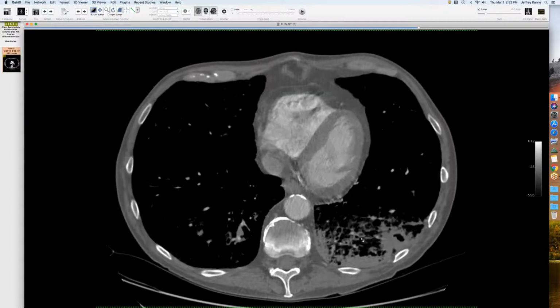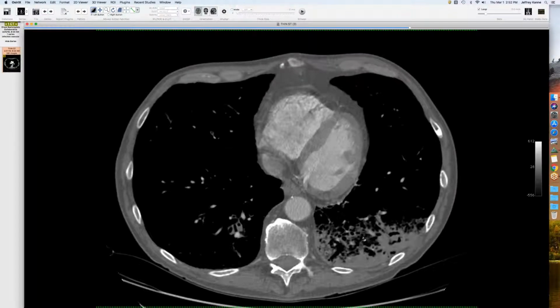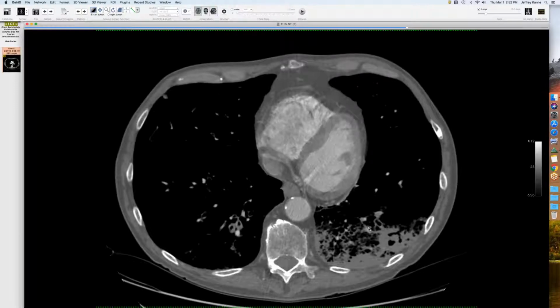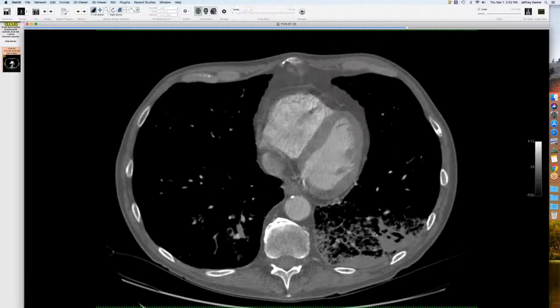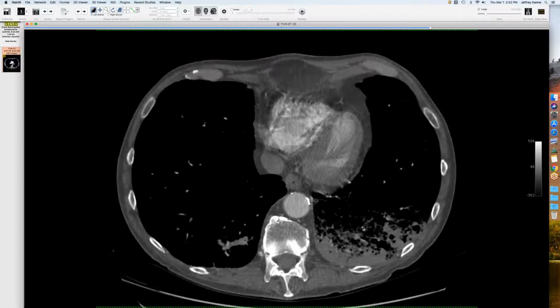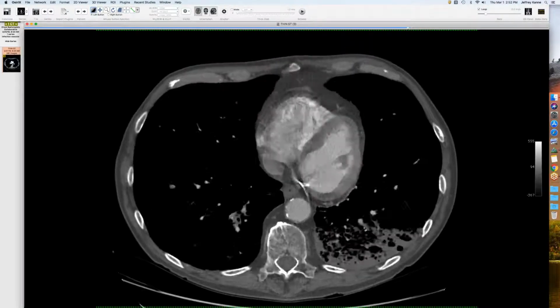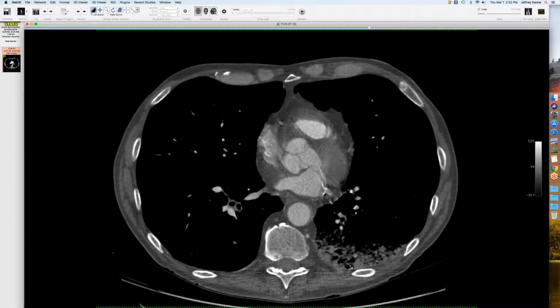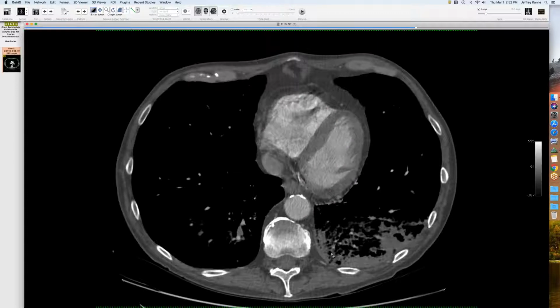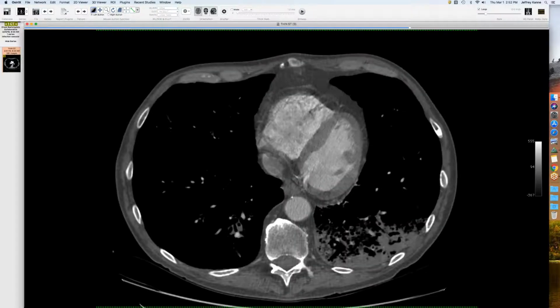But Jeff, let me turn this upside down. Could there be a pseudoaneurysm that has bled, and the consolidation you're seeing is blood, which is settling? It could be, and some of it might be, but there's a clinical infection, fever, leukocytosis. There may be some blood in there, but he's not having that much hemoptysis, I think, to account for all this. And it persisted over multiple studies. I don't expect it to change or wax and wane. Okay. But yeah, it's a good thought.